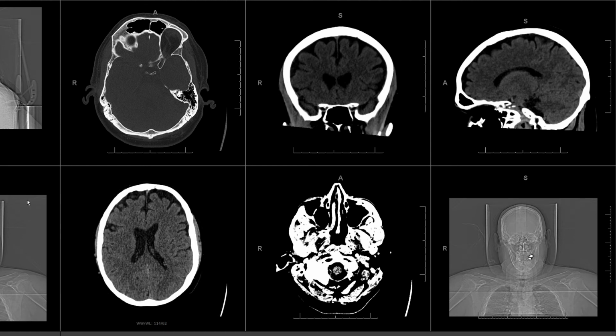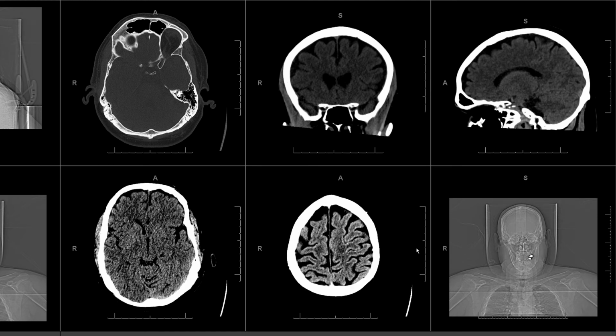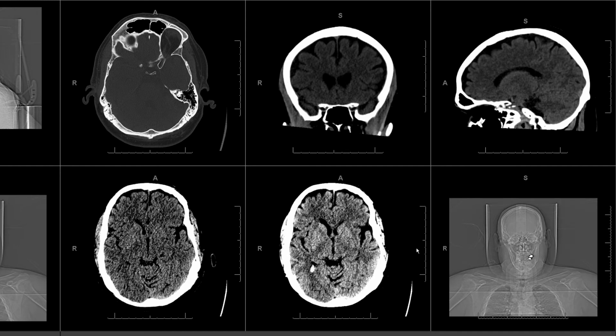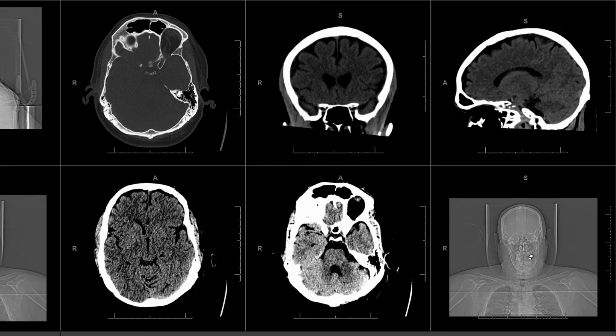Now let's move to looking at the ventricles, the ventricular caliber, any mass effect on the ventricles. Next, let's look at gray-white differentiation. We want to make sure we see the normal basal ganglia, including the caudate, the putamen, the globus pallidus, the insular ribbon, thalamus.